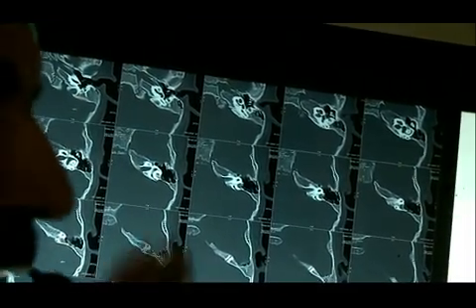This cochlear base defect can lead to a CSF gusher. And that abnormality in terms of cochlear malformation is designated as IP3, incomplete partition 3, which has a high probability of giving a CSF gusher.